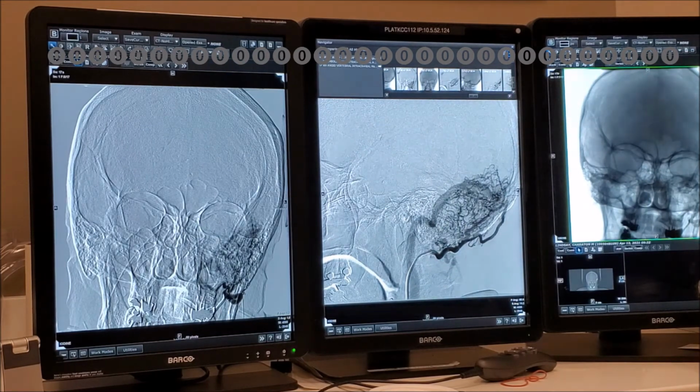So what would you say, Greg? So there's extensive arterial feeders from the left occipital artery onto the left transverse sinus with fistulization from the transverse sinus antegrade down to the internal jugular vein on the left with no retrograde flow. Right. And what are these veins here? The occipital emissary veins. And how did this one feel? It's empty. Just transosseous. And that's when this thrombosis. This is the pathway that will become, right? Okay. So, anyways, what's fascinating is that you see how this angiogenetic response is seen in the wall of the sinus. Very nice, right?